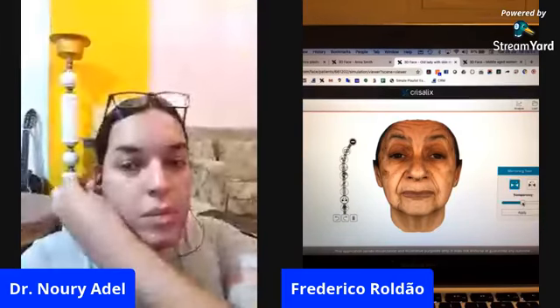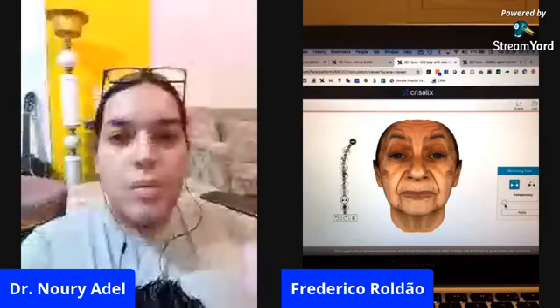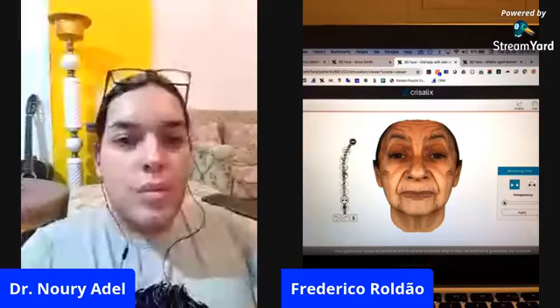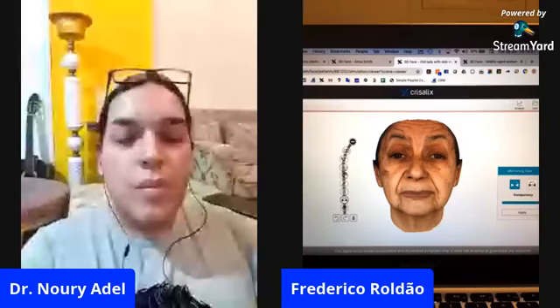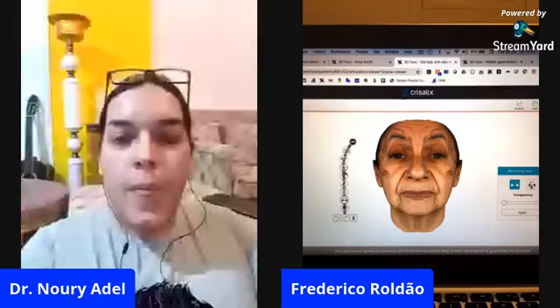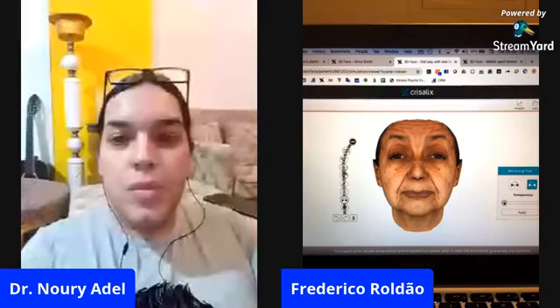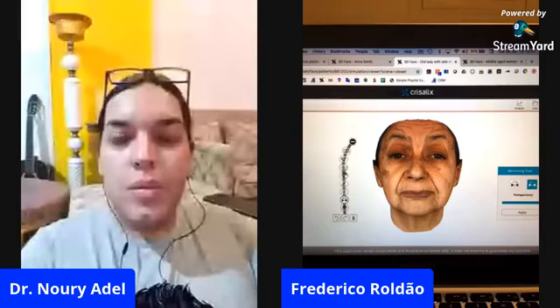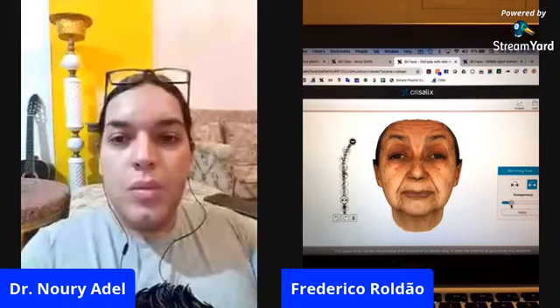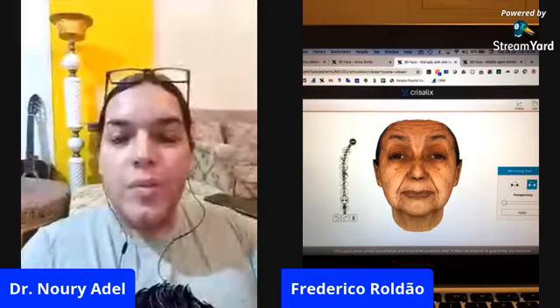So this is our patient if she was totally symmetric from right to left, and that's reality. And if I tap the other one, this would be her if she was symmetric from left to right. So again, reality and symmetrical. Okay? I will remove this.